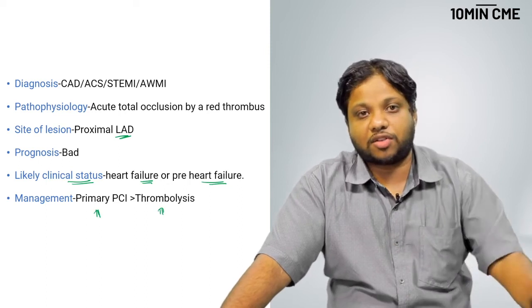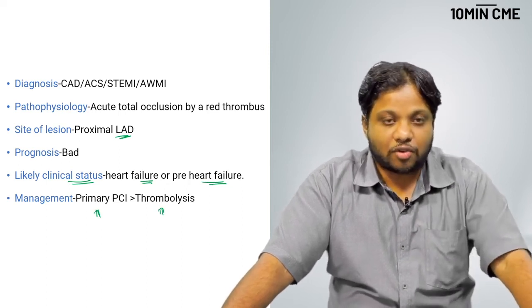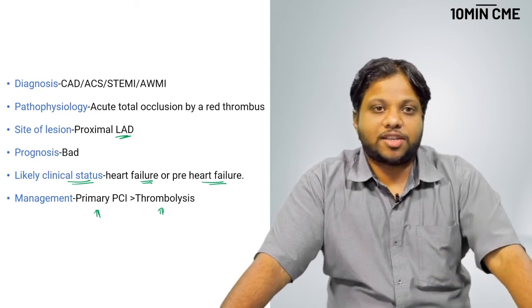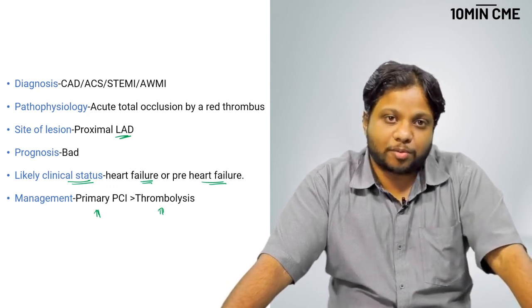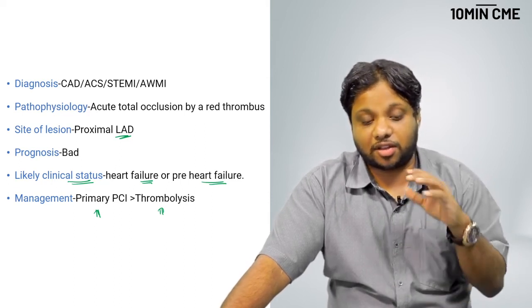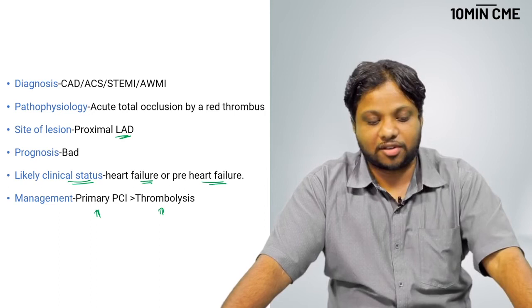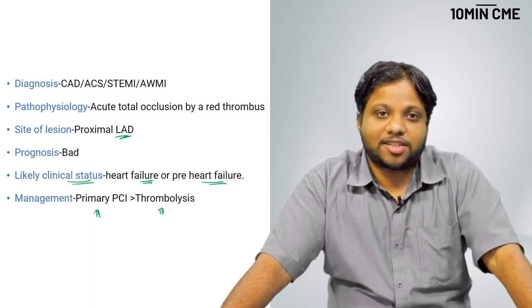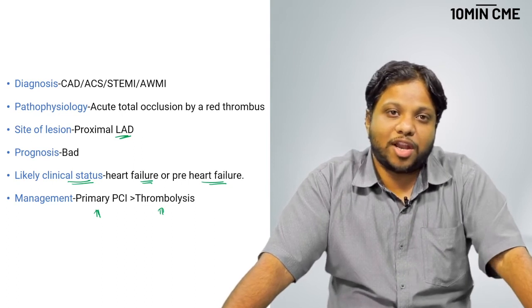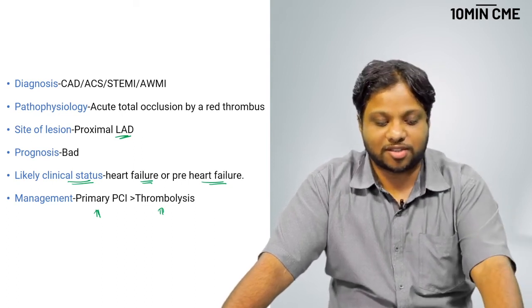Again, you can see such a lot of information you can get from the ECG if you are only willing to learn more. So, that is why I put the title as you see, but you do not observe, or do you observe. Observation is seeing something with recognition of its significance. This is what, again, the ECG is like: a murder scene from a Sherlock Holmes movie. So, if you are willing to learn, you can see a lot of clues from the ECG.